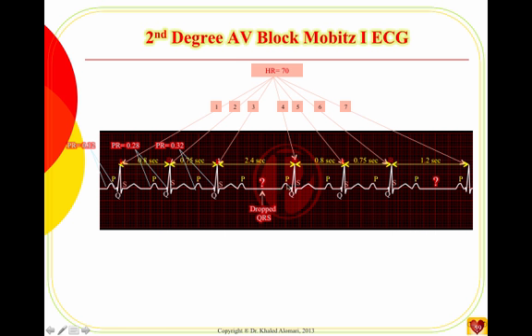And then guess what? It goes back. The cycle starts again, and here you go. So here you can imagine the area from here to right here. This is a gate. Now the gate is open all the way to here, and got closed right here. So every P here passes down and causes a QRS, but this one was blocked.